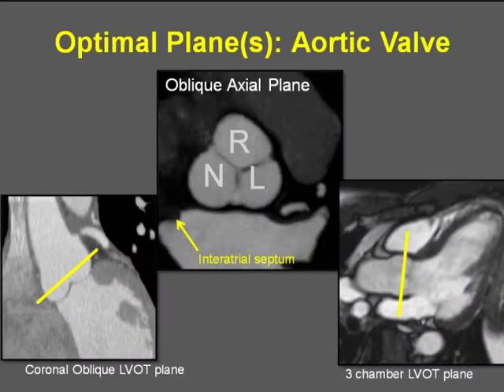And we will start first with the aortic valve. This was alluded to in the prior talk in the morning as well, where there was a question about pseudoaneurysms of the sinus of Valsalva. That basically happens because the axial sections that we obtain are not truly perpendicular to the aortic root or the aortic valve.